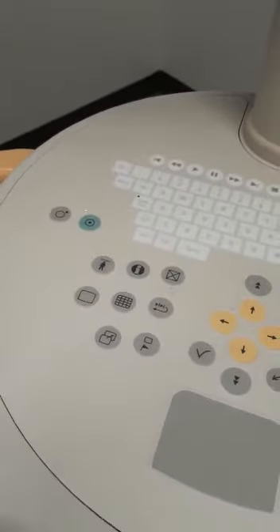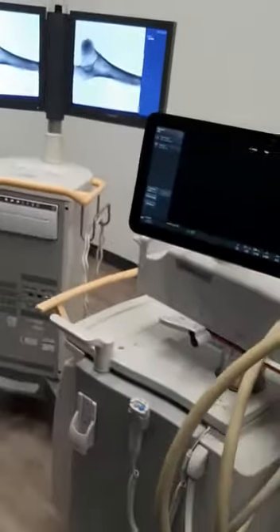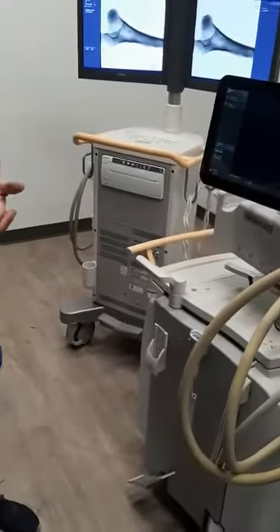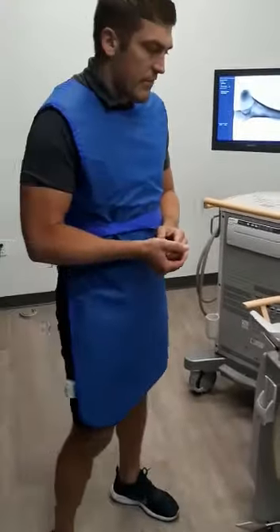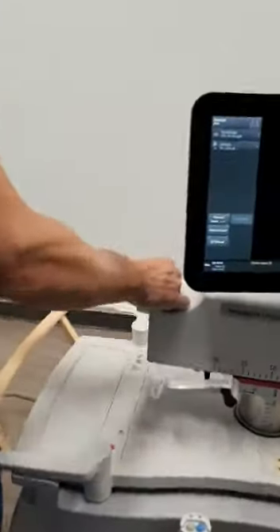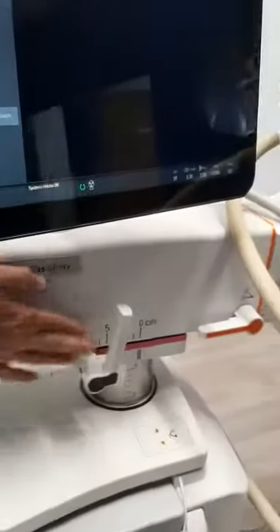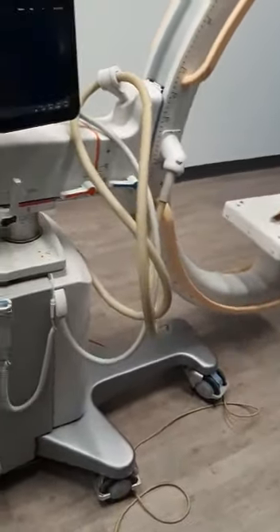from the workstation. The movements on this C-arm are the same as any other manual. This is not a motorized system. This is all done manually. Much like OEC and Siemens, you have your forward and back motion. Don't forget your foot pedal, your main brake, which is here. You have your wig-wag brake, which is also called panning. Gives you about 12.5 inches to each side.